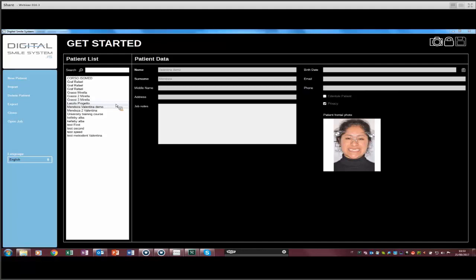Okay, at the end of the process of this photo editing software, we will import this project inside our CAD, and we will see what is going to happen. Okay, great. So in order to start a project, as you can see, there is a form that has to be filled in: name, surname, and then a small tick on privacy that will activate the export function. That is the one that is necessary to export the project inside the CAD. And then we can save it.